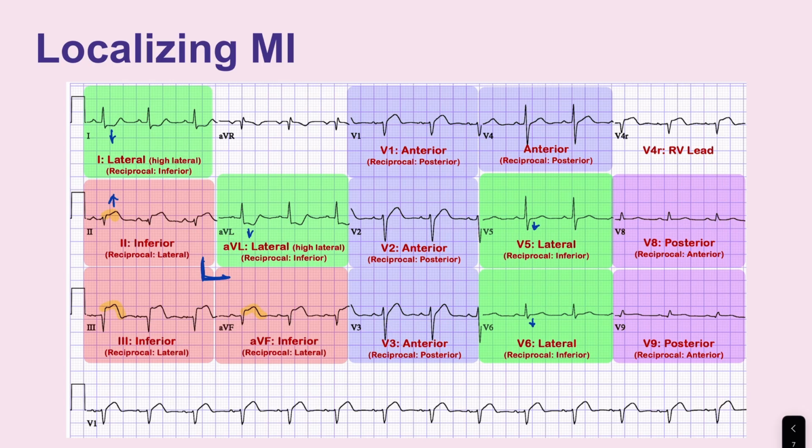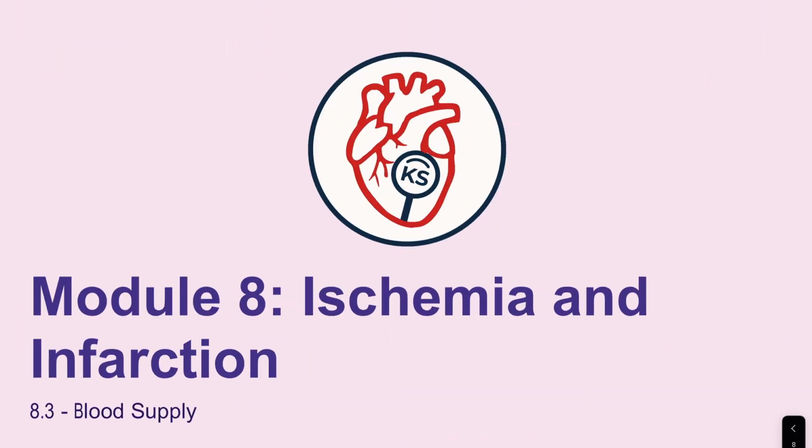It tells you more about the location. So don't necessarily say, oh, well, it's hardly depressed over here, so that's not a reciprocal change. Remember, we have 12 pictures, so use all of the pictures to your advantage.